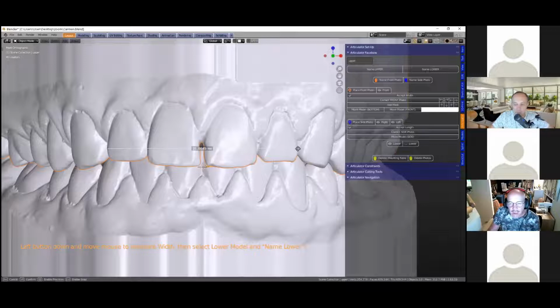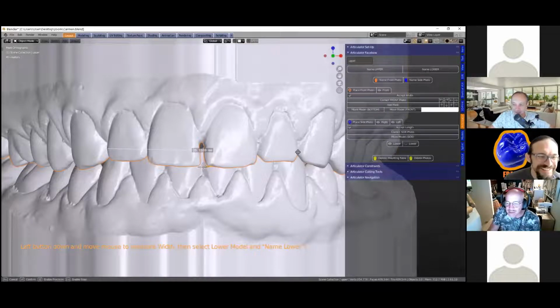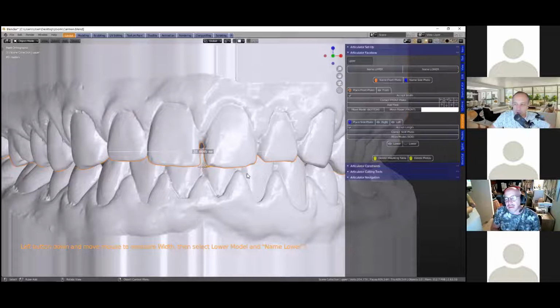So beforehand, we had the measurement of the pupils, but that's not enough because some people have really black eyes, and some people have tattoo ink in their eyes, like blue or something, and you can't actually make a measurement. Also, it's a little bit awkward taking a ruler, and who's got a ruler in the surgery? Maybe some people do, but it is more complicated than taking an object that's already existent in the 3D world, and it's a true to life scale.